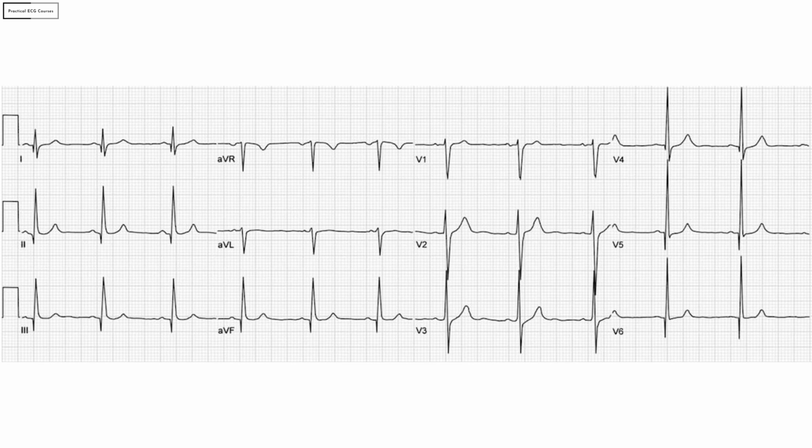And then coming to the R wave, you can see that the R wave is actually tall. If you measure the R wave here, it is 24 millimeters, sorry for the mistake. And if you look at the S wave amplitude here, it is 12 millimeters. So that comes to a total of 36 millimeters, which confirms that we do indeed have tall R waves and we actually have an LVH. But forget the LVH, we just needed to confirm that we did actually have tall R waves. Now we have identified two pathologies, tall R waves and deep Q waves. What else?